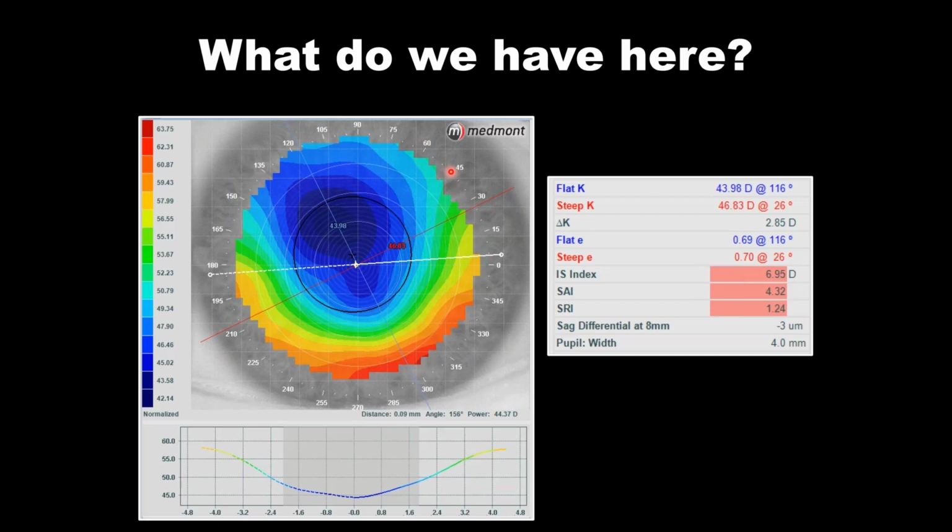Now, we could have done a composite topography to see if pushing the rings to the peripheral cornea would have allowed us to get a little more information. But this was a screening visit, so we didn't spend any extra time on doing that composite topography.